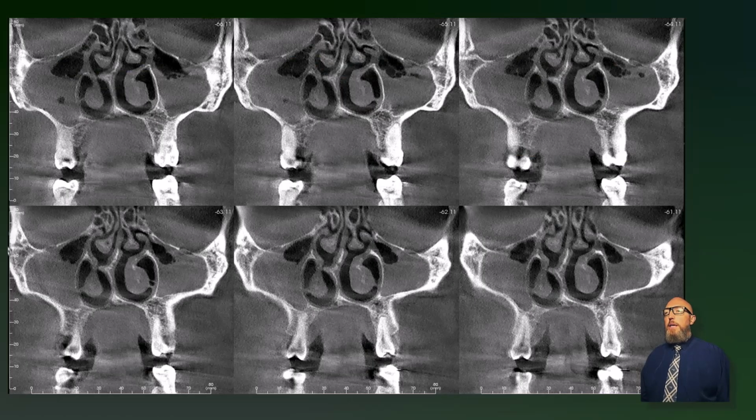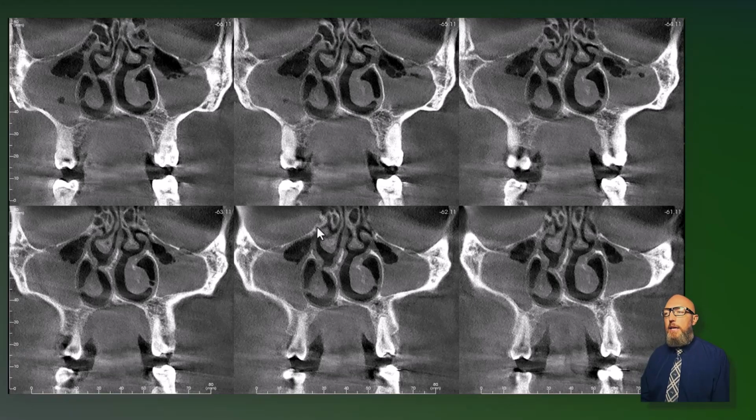And this is showing us several coronal slices. It looks like in 1 millimeter increments, coming posterior to anterior. And what do you notice inside the sinus? Not just air fluid level, but there's this kind of frothy, bubbly appearance, a strong indicator of acute sinusitis. Drainage still looks mostly patent, but still it's worth reporting on, correlate with symptoms, because they potentially have some sinusitis going on now.